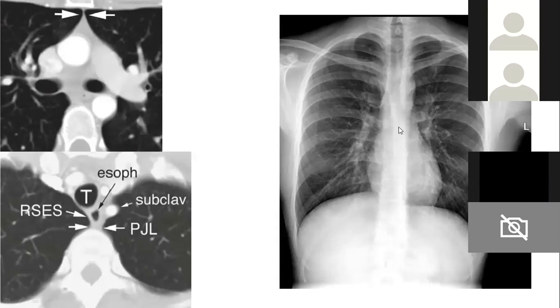It is just short. It starts below the level of the lower part of manubrium, the manubriosternal junction. The anterior junctional line starts there, crosses the midline just to the left and ends here. It's a short line again. This is called the anterior junctional line.